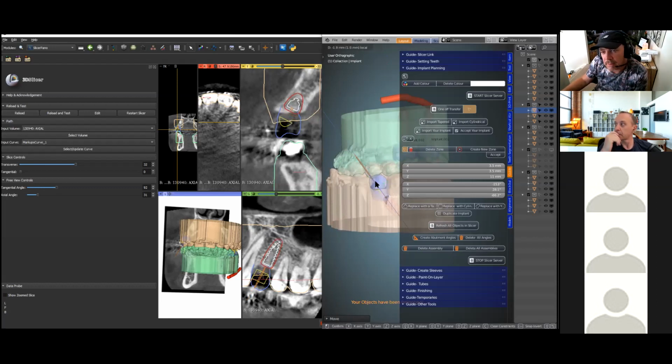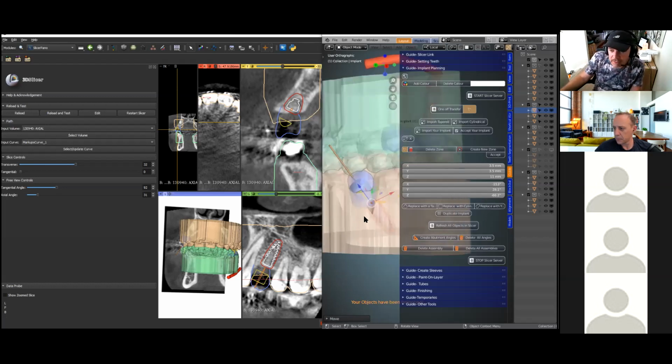So maybe can we open up the floor here and see if anyone has any suggestions? Yeah. That would be quite good. And about the safety zones, can you set those as well, Michael? Yeah, it's set at 2 millimeters. If you wanted to delete it, we've got in the video exactly how to delete it. You click on this, delete safety zone, and create a new one. So it's pretty straightforward to do that.